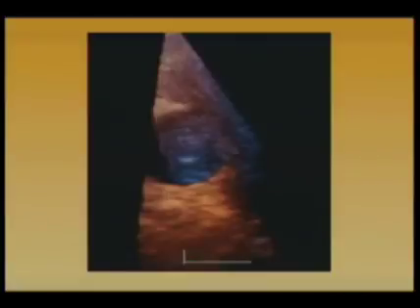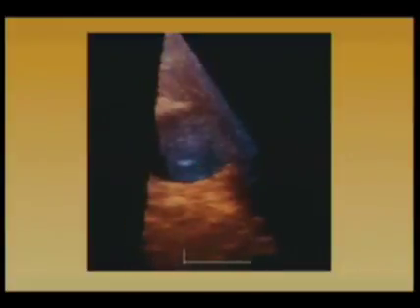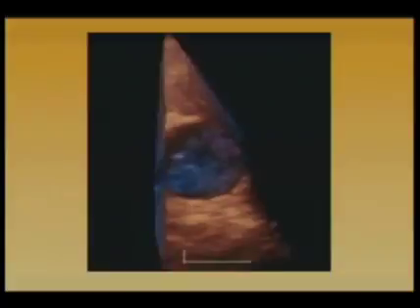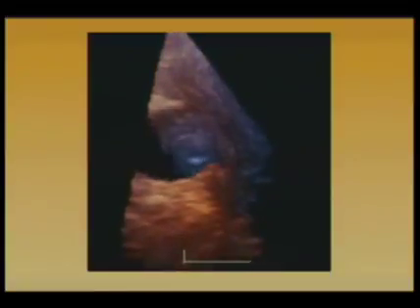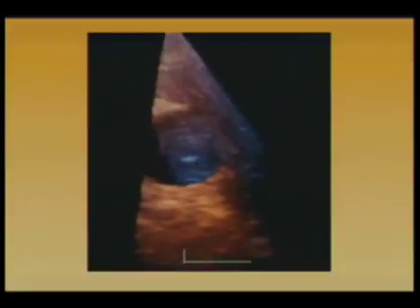And another image of a gallbladder showing that we can actually see fairly small structures. This is the gallbladder lumen, and that bright echogenic spot along the anterior non-dependent gallbladder wall represents a calcified polyp. I was actually quite surprised, given the resolution limitations of 3D ultrasound, that I was able to see this structure, which is fairly small, on the 3D reconstructed image.